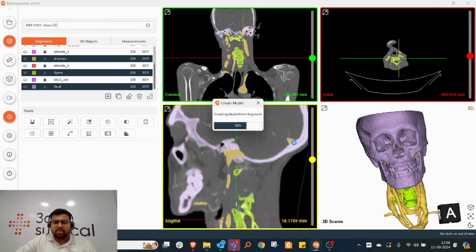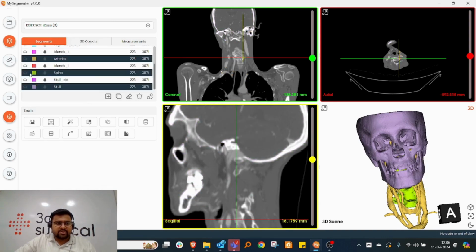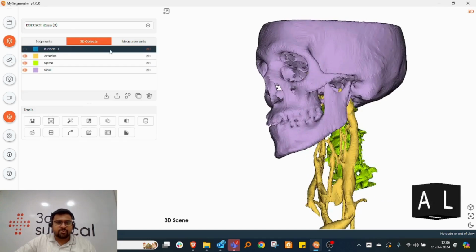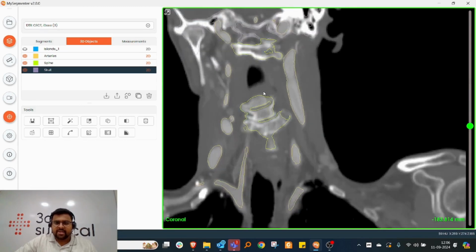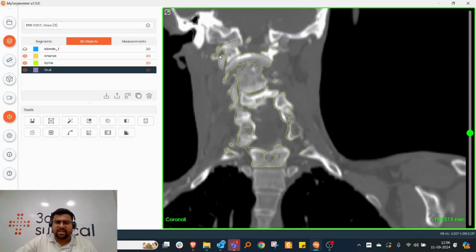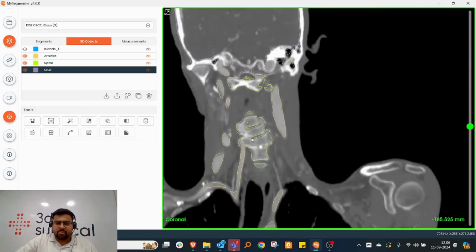an STL file, or we can say a mesh file, out of the mask. So I'll close this, I'll maximize this, and we'll go to it. This is the older one from the previous segmentation where I imported the bone related information from here. Okay, so now I click on 2D visibility. It will also show me how the 2D contour is matching with the anatomy. So see that it is very clean. It is free from overlap and all, and it's capturing well.